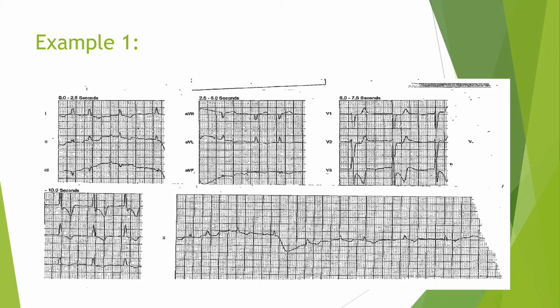So this example one, I apologize for the poor copy here. This is a left bundle, patient's having chest pain, and it was ruled basically that because it's a left bundle, we can't tell, and they didn't know if it was old or new, which by the way, has absolutely no relevance in medicine. It doesn't matter if it's old or new, it has to do with these criteria.